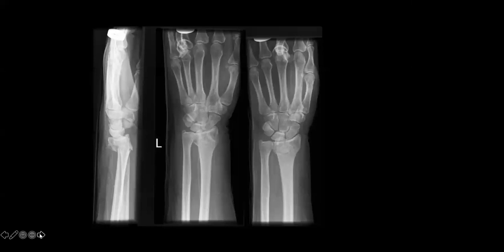So those of you that have sat exams and those of you that are yet to sit them, you'll know that this is a Colles fracture. Now, personally, I really hate these names. They're called eponymous names. I think fractured distal radius with a description is much more helpful. As you know, there's also something called a reverse Colles fracture or a Smith's fracture. And I think you run into the risk that you can often get the two types confused as to which fracture means what on the X-ray. But if you actually just concentrate on accurately describing the anatomy, neither you yourself nor the person you're explaining the findings to can get confused with what X-ray shows what.